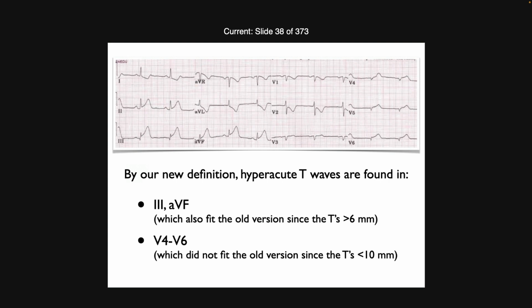Now, where else on this 12 lead can you see where the size of the entire QRS can fit inside the T wave? AVF. AVF, correct, and which other leads? It's on the slide, but you can find it by looking. Where? Oh, I guess you're right. Yeah, I hadn't thought of it there, but yeah, I'll say that.